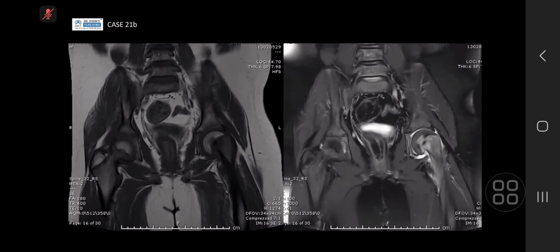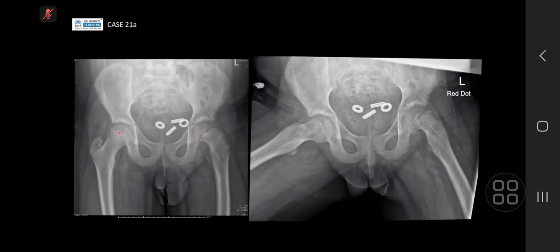Okay, so you've got another MRI that was done. Does it confirm or refute the diagnosis? Yes, it confirms the femoral head epiphysis is subluxed posterior-medially with joint effusion, and findings are suggestive of slipped capital femoral epiphysis. Yeah, good. So exactly what you've said. There's asymmetry of the physeal line. So you've got widening, sclerosis, and most importantly, you've got the slip, which is best identified on the frog lateral view. You talked about Klein's line. We'll talk about that in a bit.